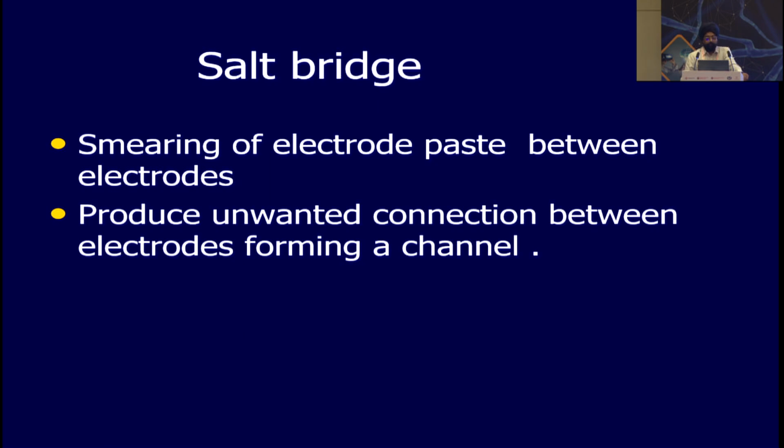Then you have the salt bridge phenomenon. Smearing of electrode gel placed between two electrodes produces an unwanted connection between the electrodes, forming a channel.